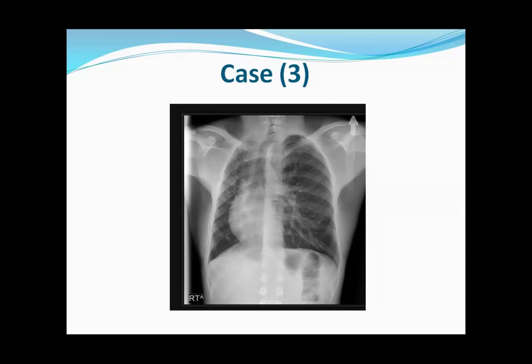Patient with shortness of breath. Frontal radiograph of chest, which shows a reduction in volume of the right hemithorax. There is ipsilateral mediastinal shift with hyperexpansion of the left lung. The pulmonary vasculature on the right side, the pulmonary artery also appears to be hypoplastic.